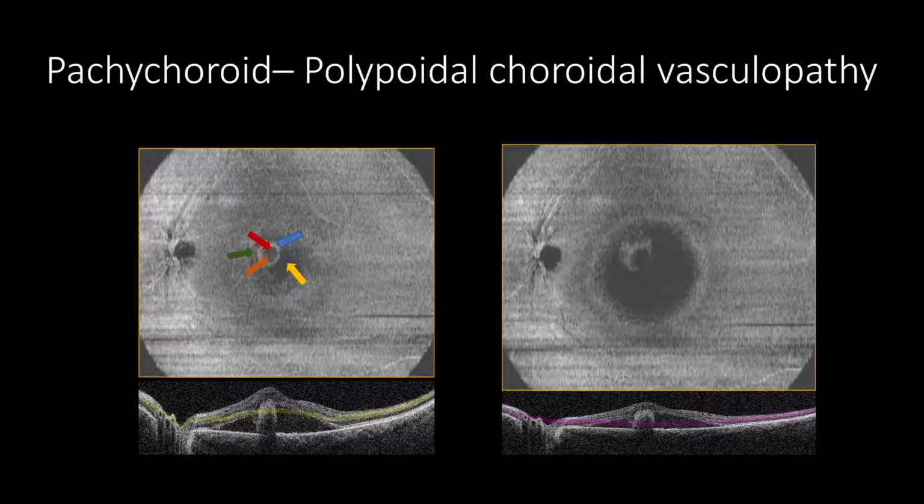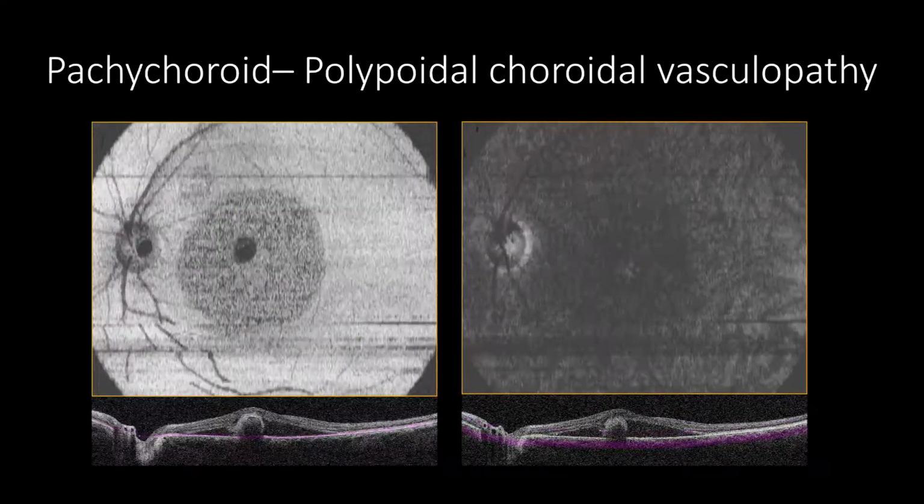Adjusting the slab will show the extent of the polypoidal choroidal vasculopathy from Bruch's membrane to the RPE layer and abnormal vascular network. Some cases can exhibit hyperreflective dots that are sites of polyp penetration of Bruch's membrane. The RPE slab will show projection artifacts from the subretinal fluids, but shows the PED area as a hyporeflective circle with hyperreflective borders. In this case, the hyperreflective borders are masked due to shadowing. Please note motion and blink artifacts.